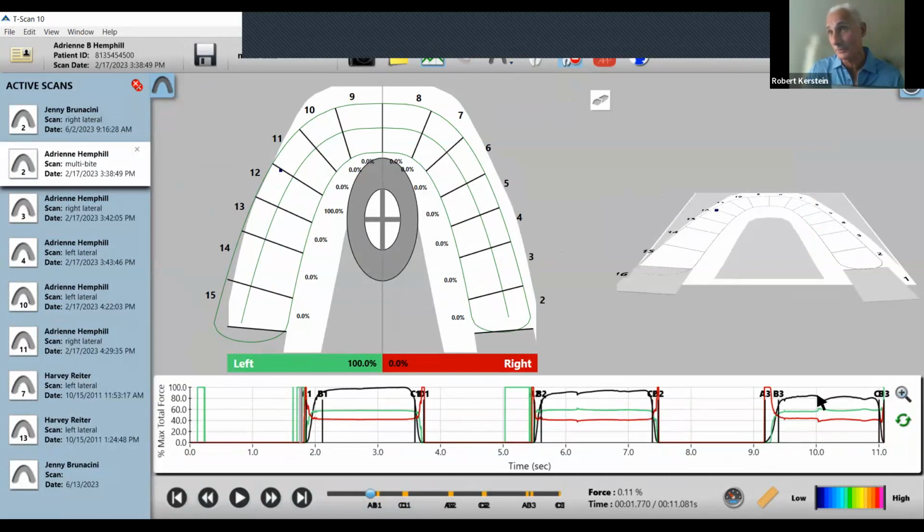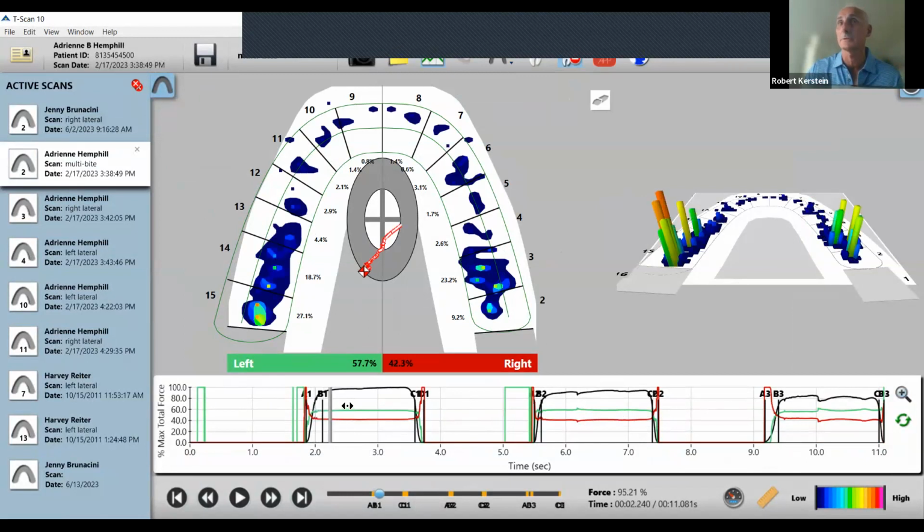The third closure is weaker, she loses more force, right? So she gets weaker as she bites. That's a sign of dysfunction. That would be a reflection of her muscle physiology. She's only 8% imbalanced. She has a lot of posterior tooth contact, not much anterior tooth contact. That's a common look for a dysfunctional patient. So the closure graph illustrates the beginnings of dysfunction.